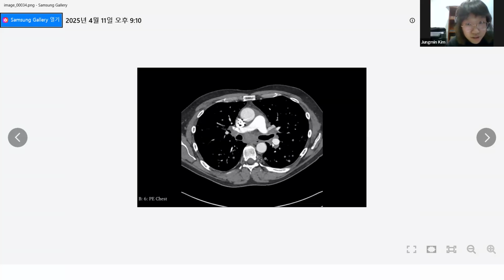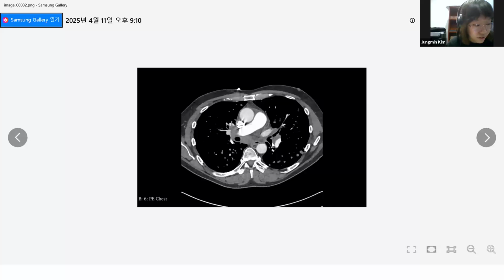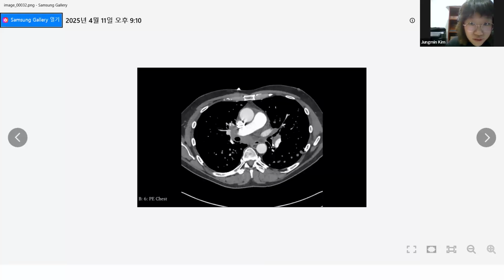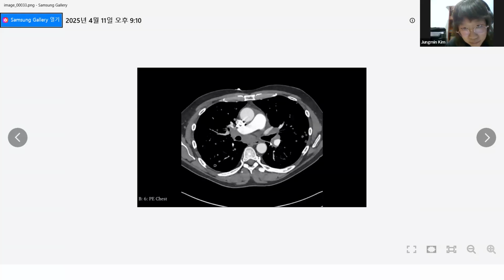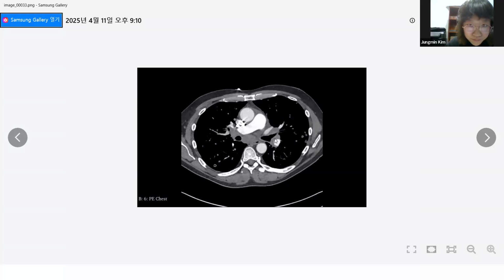And there are interlobar lymph nodes right here. You can see the bronchus splitting, and there's something thick and gray in between. I think that's an interlobar lymph node, a bit enlarged.